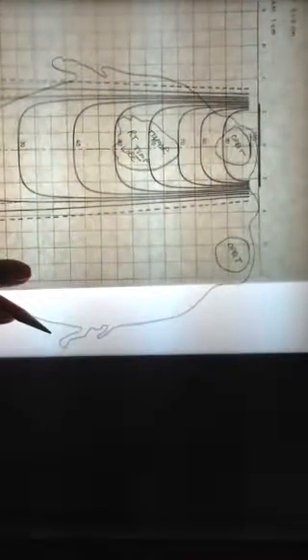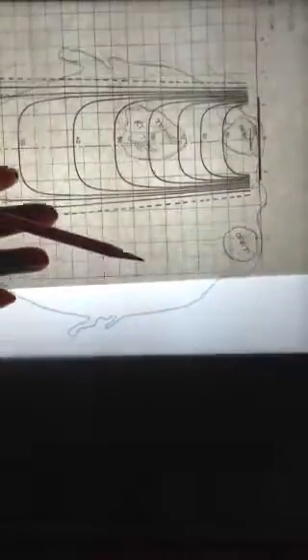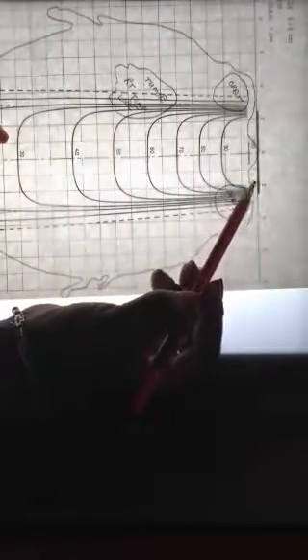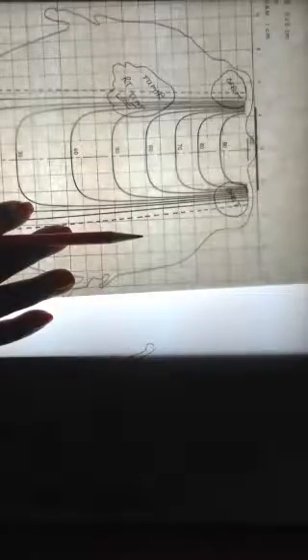I could put it here, and the T-bar needs to go at the beginning of tissue. You see on this side of the beam there's missing tissue. On that side of the beam there's missing tissue, an air gap. If I put the beam here, again I have to put the T-bar at the beginning of tissue. Then I have missing tissue on this side of the beam, and also missing tissue or an air gap on that side. You can select wherever you want on the contour to put your beam to do the shift technique, as long as the contour is not flat.